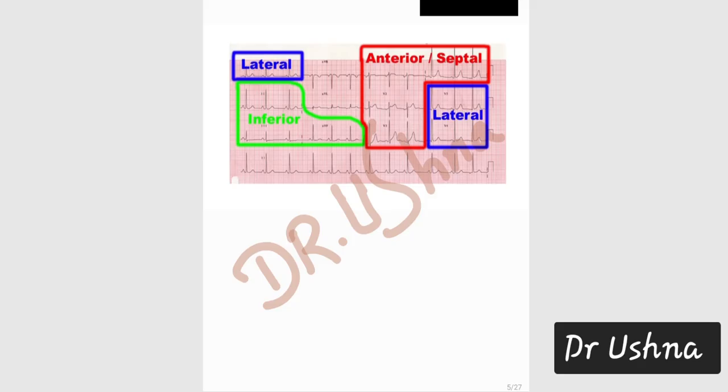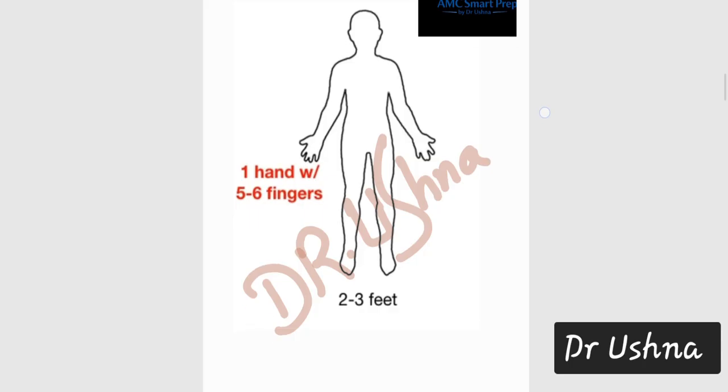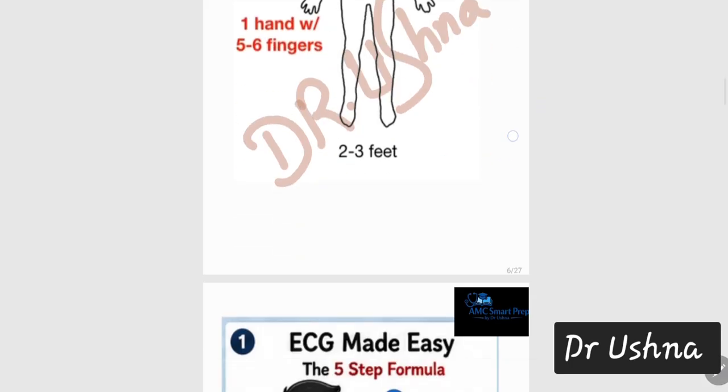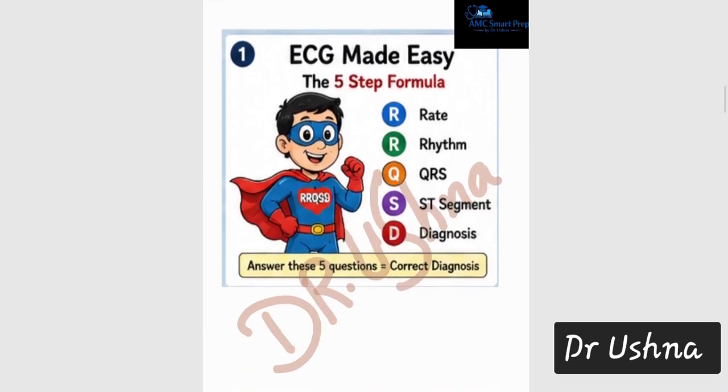So this much information you must know about reading the basic leads of the ECG whenever you are interpreting the territory involved in an ST elevation or non-ST elevation MI. This is very important. So make sure to take a picture of this slide, or take 2-3 seconds to absorb this information. Then, how you are going to read the ECG.